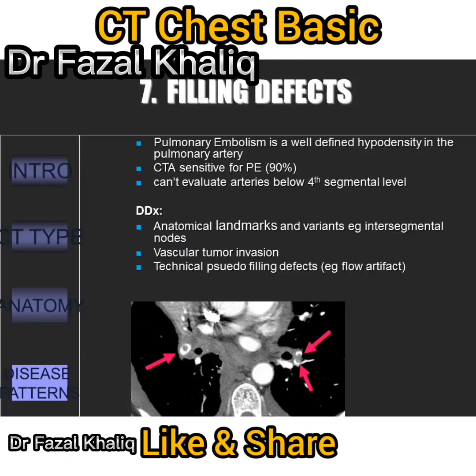Last, technical pseudo-filling defects may also mimic pulmonary embolism due to inappropriate selection of injection parameters, flow rate, concentration, scan delay, or breath holds. Remember, clinical correlation is required.